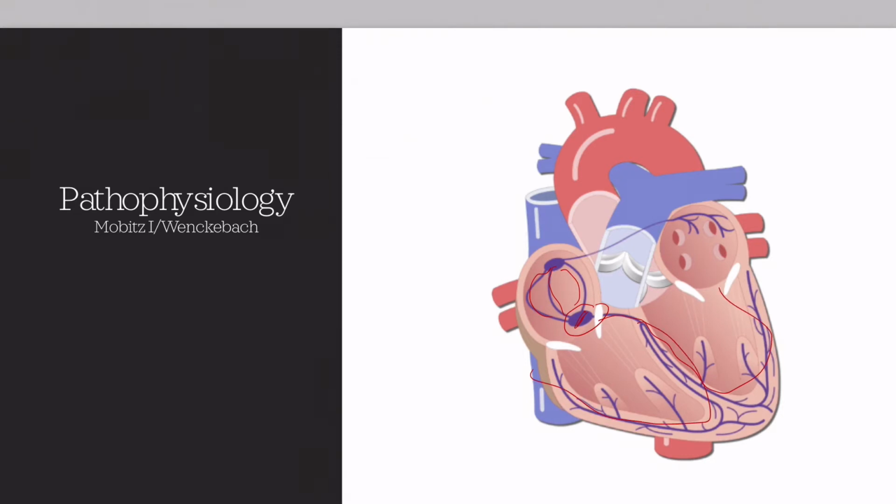But what's occurring is every time we send a signal on through the ventricles, our AV node cells are taking longer and longer to be ready to send the next signal. So what we actually have is atrial contraction, signal being sent through the AV node, and each time our PR interval is getting longer and longer, so that finally we send a signal to the AV node and it is not conducted through the ventricles. So we call this a block or dropped beat.